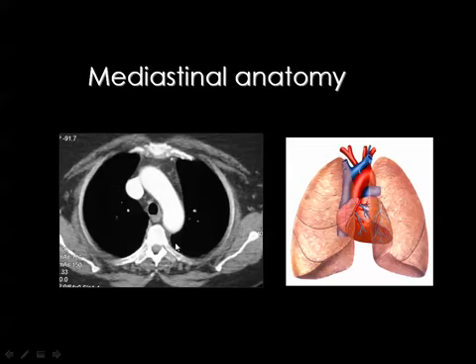Then, starting interpretation of the chest, you should put your finger on the banana, and this is the arch of the aorta. And if you look here, what is beside the arch of the aorta, you'll see the superior vena cava. And here is the superior vena cava and nothing more. This is mediastinal fat, and this is the trachea, and this is the collapsed esophagus, and you don't see any more anatomic details. The arch of the aorta and the superior vena cava.